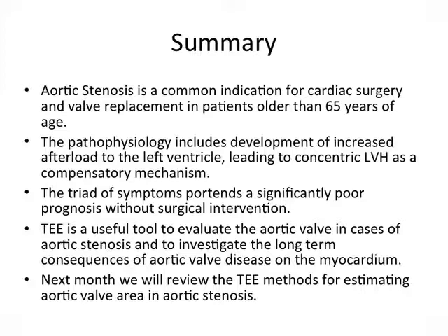TEE is a useful tool to evaluate the aortic valve in cases of aortic stenosis and to investigate the long-term consequences of aortic valve disease on the myocardium. Next month, we will review the TEE methods for estimating aortic valve area in aortic stenosis.